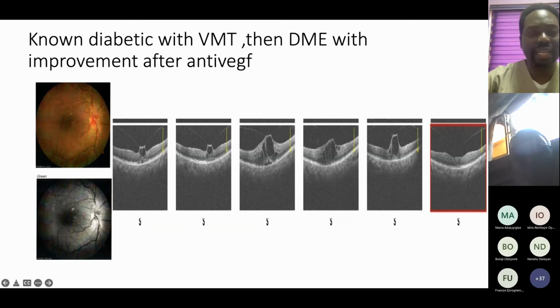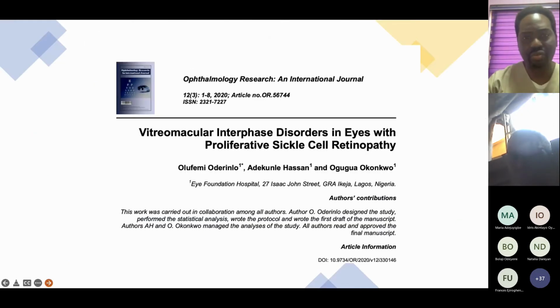You know, in the red free light, it shows white, and then you can see the vitreomacular traction here, and at this point, he developed macular edema, and we started the patient on anti-VEGF injections. And after 3 injections, the macular edema has resolved significantly. Of course, like I said, we are not managing OCT scans. This is a patient, and you have to pay attention to other management, glycemic control, and other things to ensure that the patient does well.